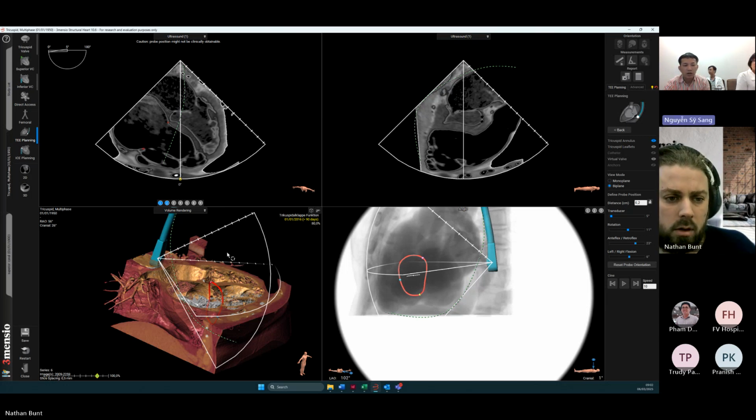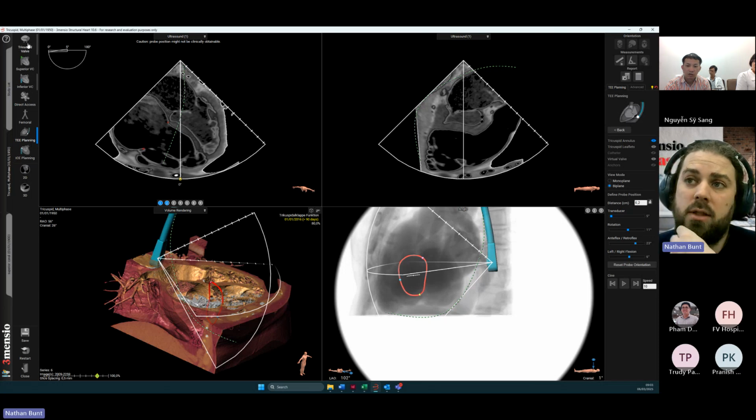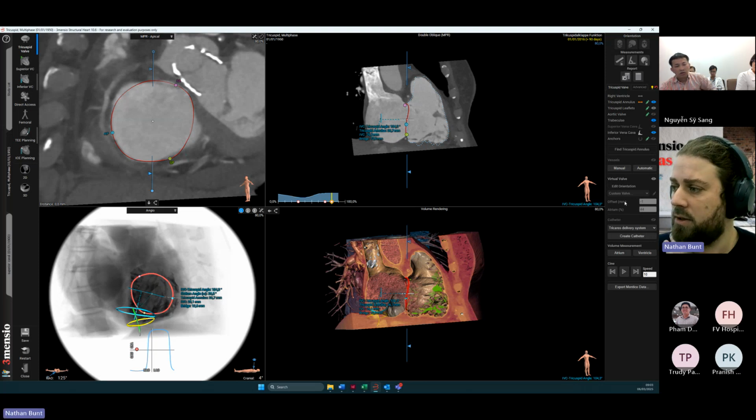So I think you can go ahead to finish tricuspid and then pulmonary valve replacement. I think we are at the end of the tricuspid workflow. So we talked about defining the tricuspid, defining the leaflets, looking at the trabeculations, the inferior and superior vena cava, the vessels and the valve.